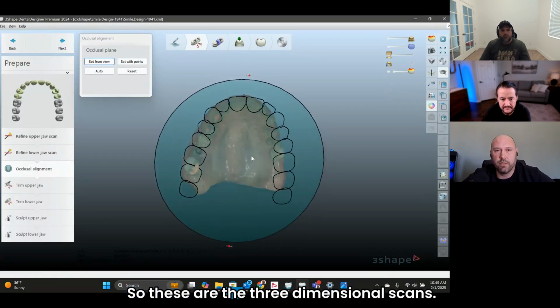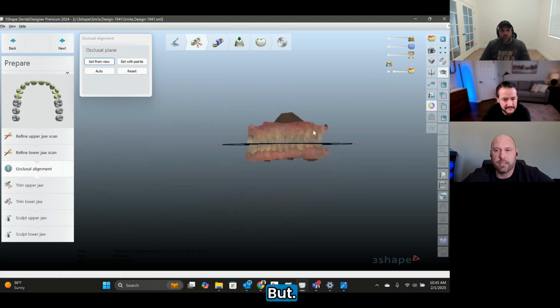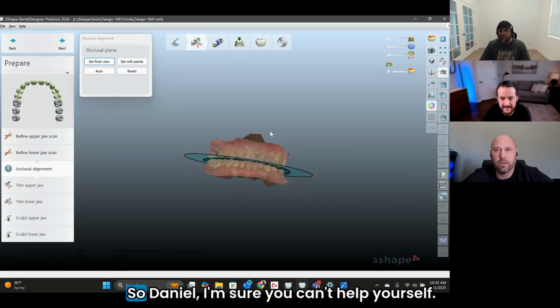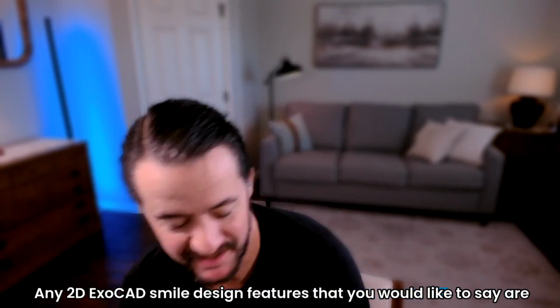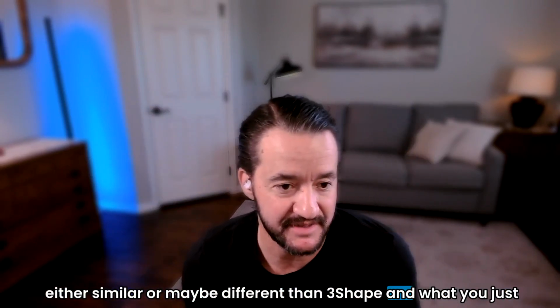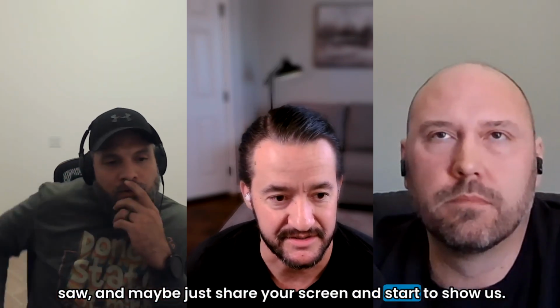So these are the three-dimensional scans, if we want to jump right into that. But let's let Daniel show the 2D smile design in Exocad. Go through that. Daniel, I'm sure you can't help yourself. Any 2D Exocad smile design features that you would like to say are either similar or maybe different than 3Shape in what you just saw, and maybe just share your screen and start to show us.